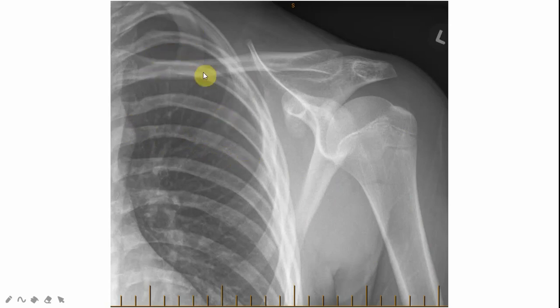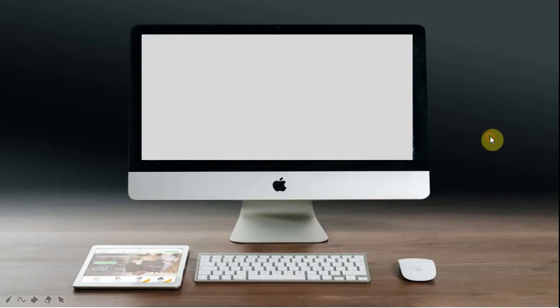So my interpretation from here is this is a suboptimal view, left clavicular views X-ray showing no obvious bony injuries. However, I cannot exclude the injury of the sternoclavicular joint on this side. So I have arranged CT head, neck, and CT chest as well for this patient.